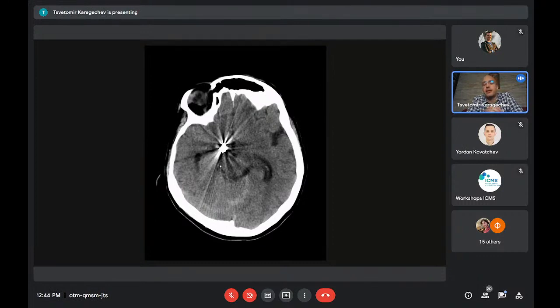And in this example, this is a patient who had a ruptured aneurysm in the circle of Willis, and this is the coil that they've put in. So this is again no blood, this is metal.